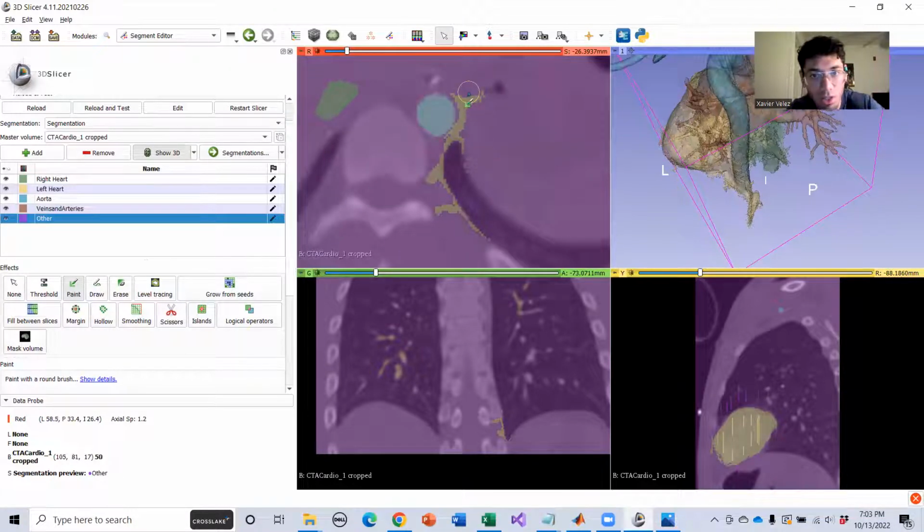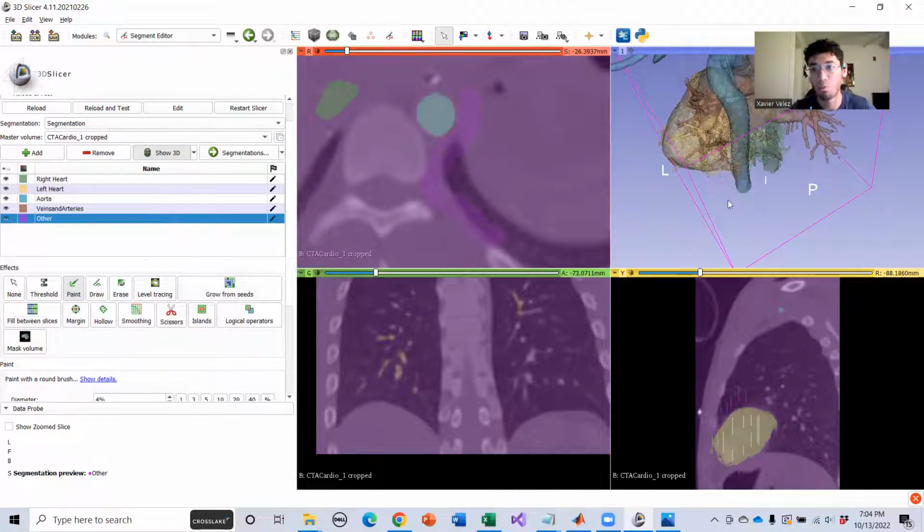That works. All of this, we don't want that. That is all junk. So I'm just going to paint it with other, let it load, and hopefully we should see around this part of the screen all that yellow noise down there go away. Fingers crossed. Yeah, boom, just like that.